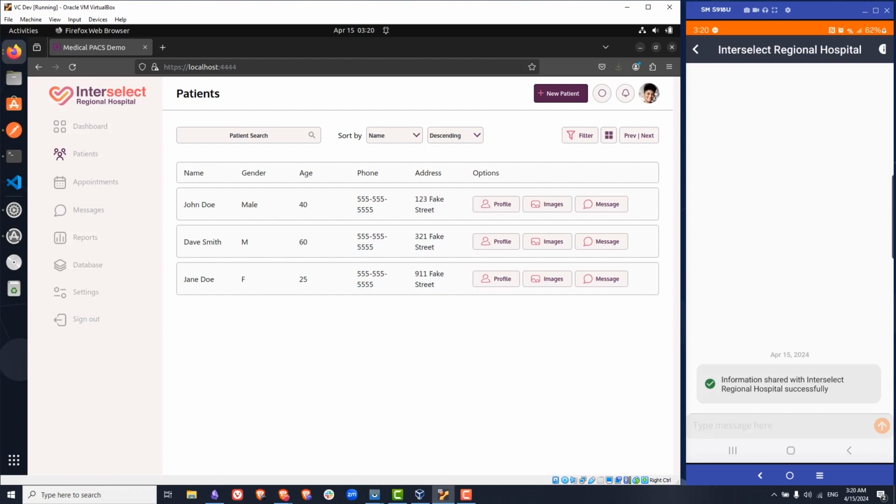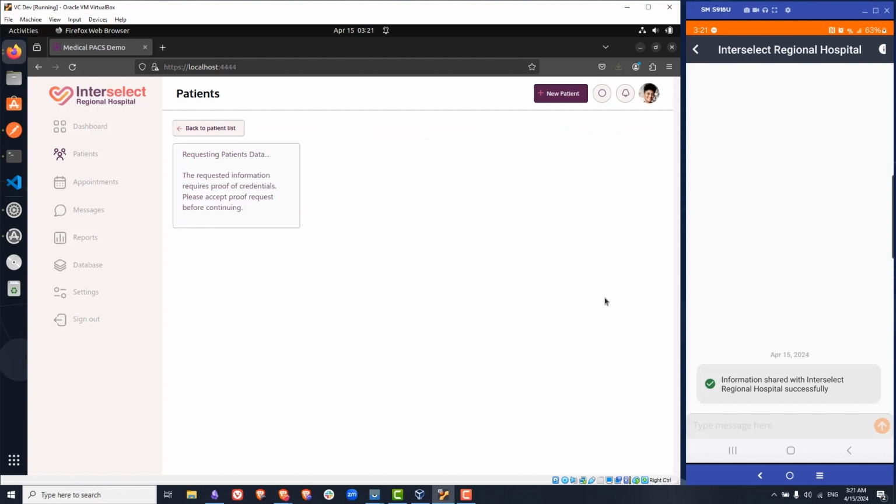And then when we go to take any further sensitive operations, especially if we're using a zero trust model, it's going to ask us for our credential again to make sure we're still connected and it's still us. And then it'll look at our credential and those attributes perhaps a little more thoroughly or specifically to see if we have the rights to access a particular patient and patient's data. So we'll go ahead and we'll look at John Doe here.